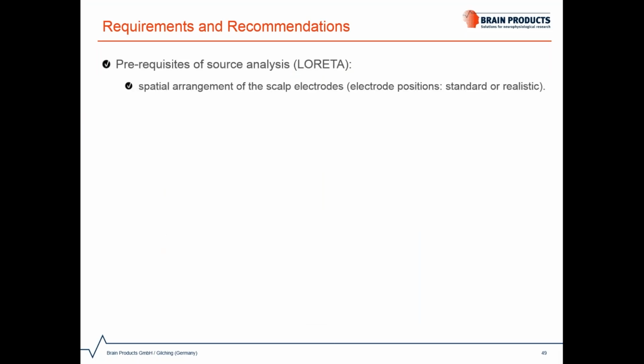So first, the prerequisites. To apply LORETA or any other source localization algorithm, you need to have the spatial arrangement of electrodes, which means you need to have either the standard or the realistic electrode positions. The other most important prerequisite that is highly specific to Analyzer's LORETA is that you need time domain data. That means LORETA needs only voltage values as an input to the algorithm.